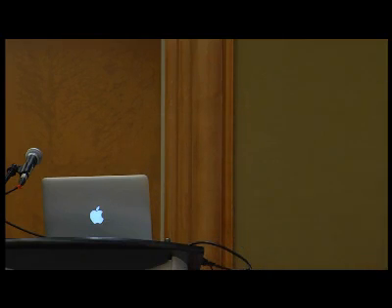Is there something wrong with this brain? Is there some atrophy going on? Left temporal. Left side. If you split the brain in half, compare this side to this side, and again split the brain in half, compare this side versus this side. Here versus there. Is there a difference?